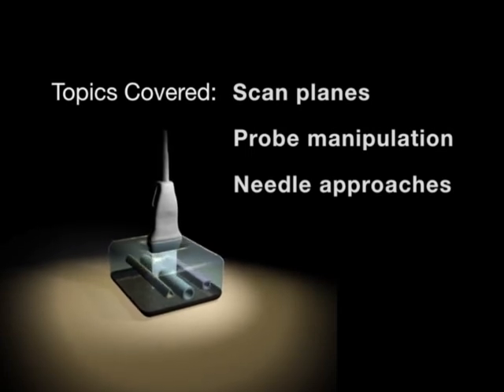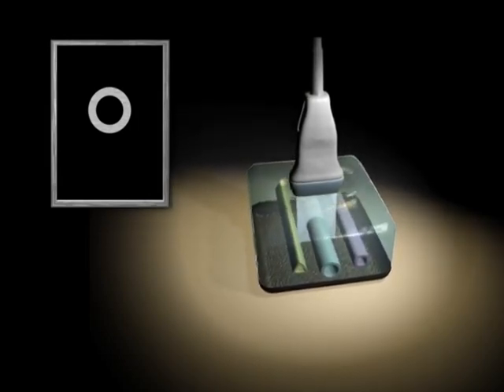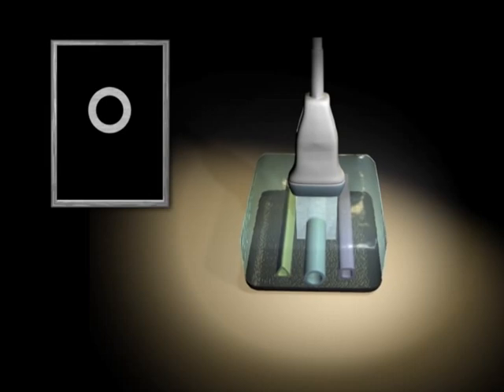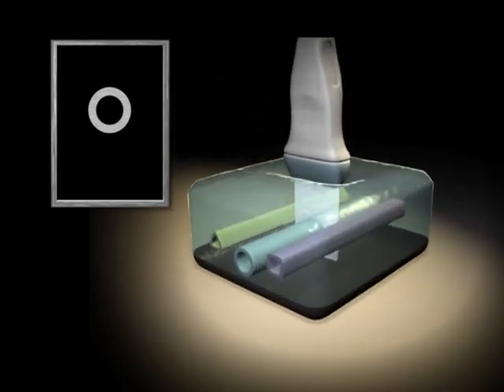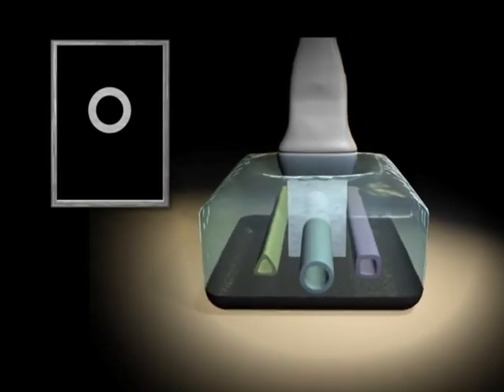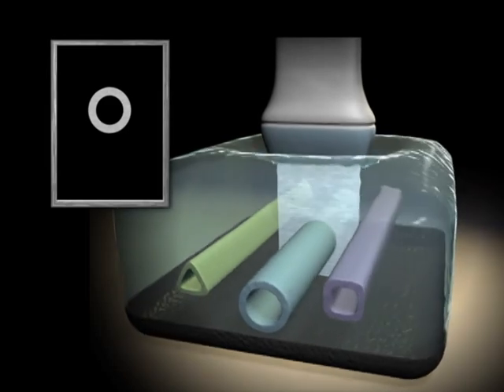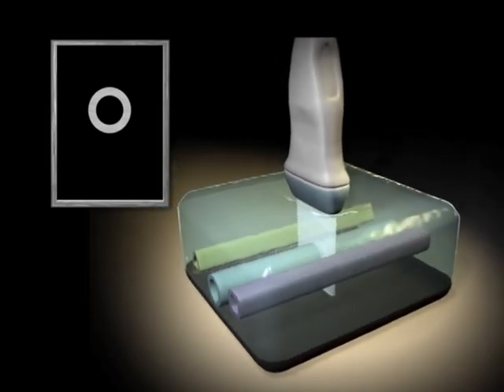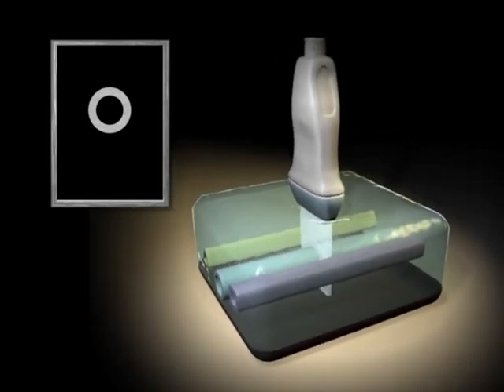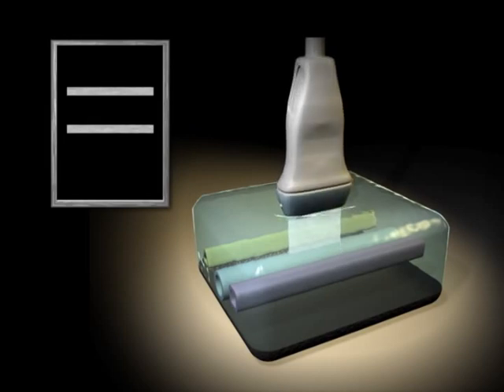In the following figures, we are looking at a schematic of an ultrasound transducer applied to a tissue-equivalent phantom with 3 different embedded objects. A depiction of the ultrasound screen is inset. We generally image long cylindrical structures with an ultrasound beam that is essentially planar. Short-axis imaging cuts this cylinder transversely, revealing a circle. Long-axis imaging cuts this cylinder longitudinally to create 2 parallel lines. Long-axis imaging is of limited use in ultrasound-guided peripheral nerve blocks.